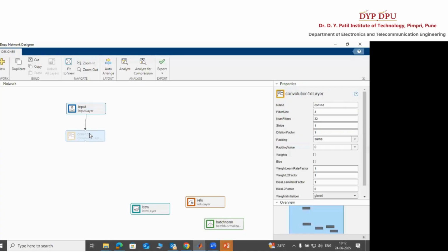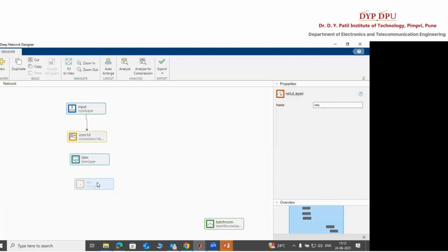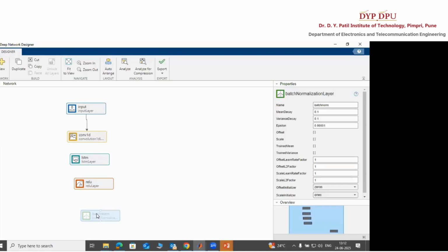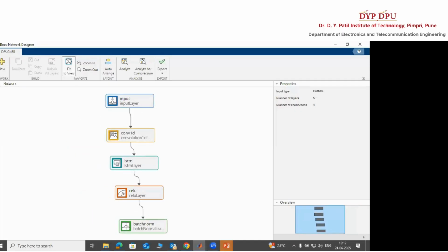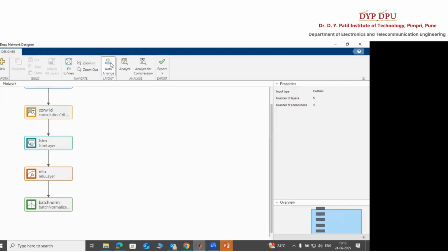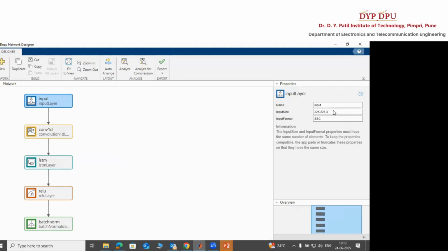Create your own model from scratch, or otherwise you use a transfer learning model. Okay, in the domain you already have lots of pre-trained networks available. Use those networks to do your work. Either auto arrange, auto rearrange. It will rearrange for you, and then you change these values. Let's suppose you put a layer, how much size of your image you can modify from here.